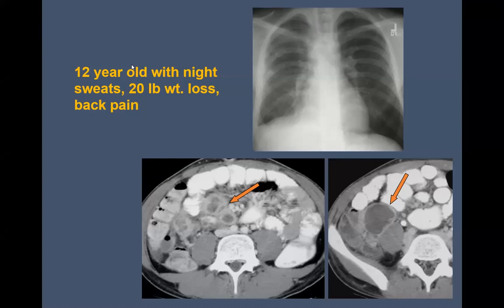All I'm seeing is Dennis here asked about the paratracheal lymphadenopathy. So you were talking up here, but no, you've got azygous vein here, and you've got superior vena cava coming up here, but those are not abnormal markings.